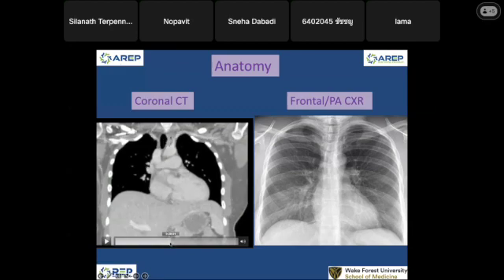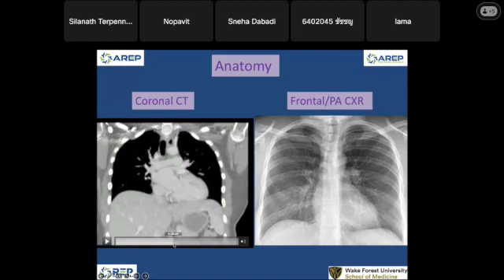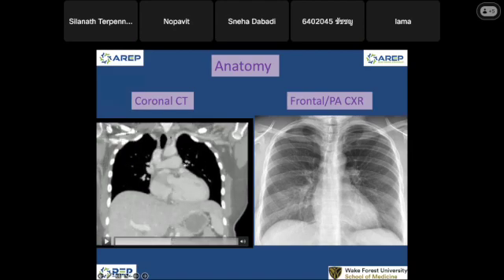And the last branch of the aortic arch is the left subclavian, this one. Okay, and you'll see that it's curved a little bit, becomes the left subclavian artery, and is going into the upper extremity.